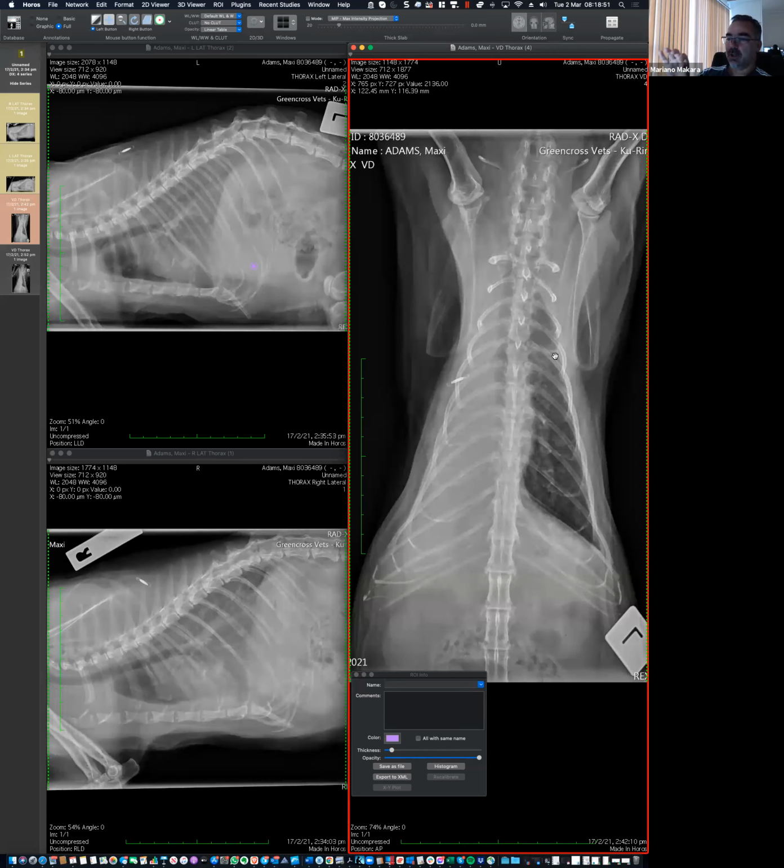Not so much as a therapeutic thing, since there are no clinical signs, not about removing pleural effusion for the animal to feel better, but as a diagnostic procedure, trying to get the cells out of those and then do cytology. I completely agree with that comment. But okay, what else could it be? How else can we explain the changes in the right hemithorax?